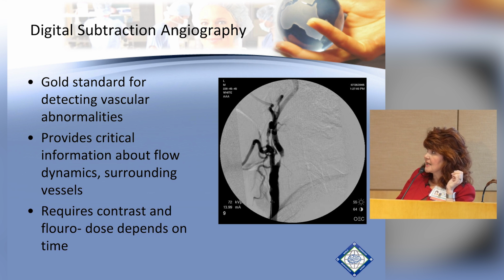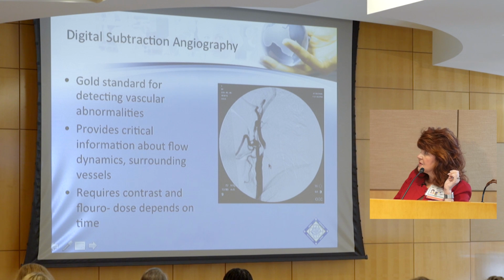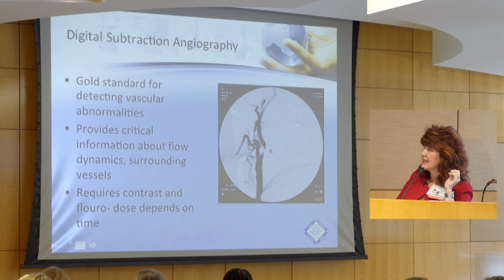What you see here is actually badness going on, right? So here is the carotid artery, and you see an extremely tight stenosis, right? I mean, this is someone who needs a carotid endarterectomy yesterday. And so this is someone I would definitely keep my eye on and think about an antiplatelet agent, making sure that they're protected from stroke, because that's a really, really, really tight vessel.